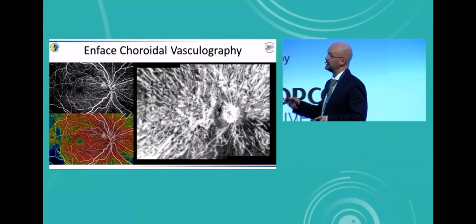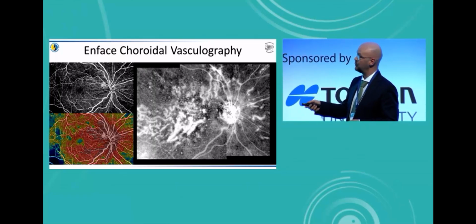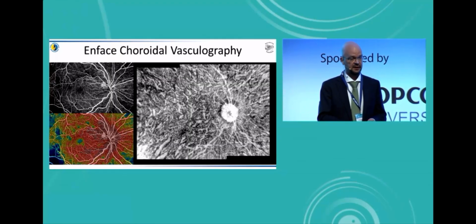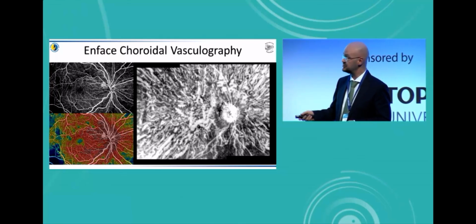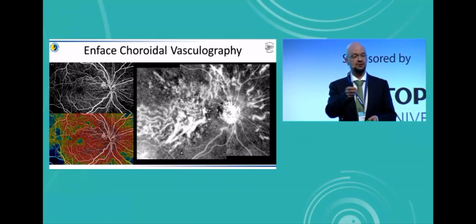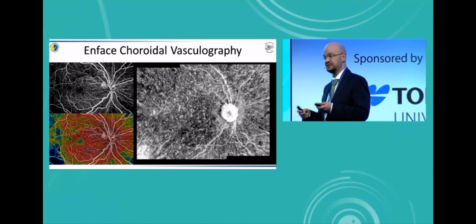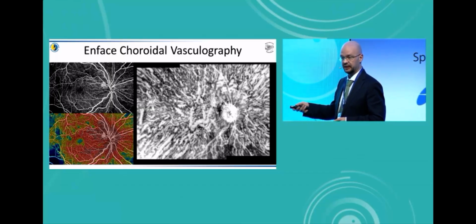Now, the very important thing to realize here is that what you are seeing here is not flow data, it's structural data. Because I found out that if you, instead of using the OCTA data, use the structural data inside the OCT, which is inherent in the OCT anyway, and you invert it and resegment it, then you can suddenly get all of these vessels very, very clearly.